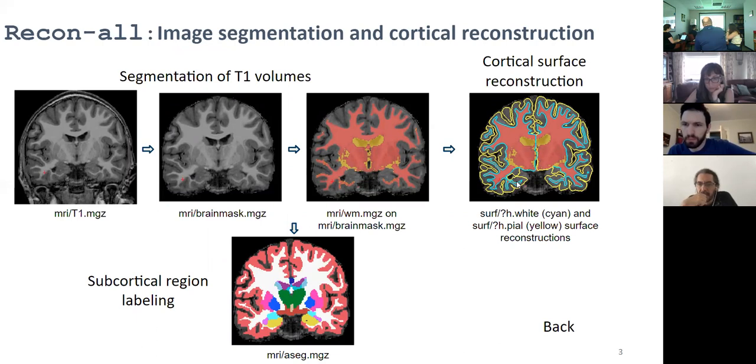And we've already seen, I think everyone now has seen, the effects on EPI images like functional MRI data and DTI data, where you'll get falloff in these basal temporal areas, and if I went more anteriorly, frontal orbital areas.